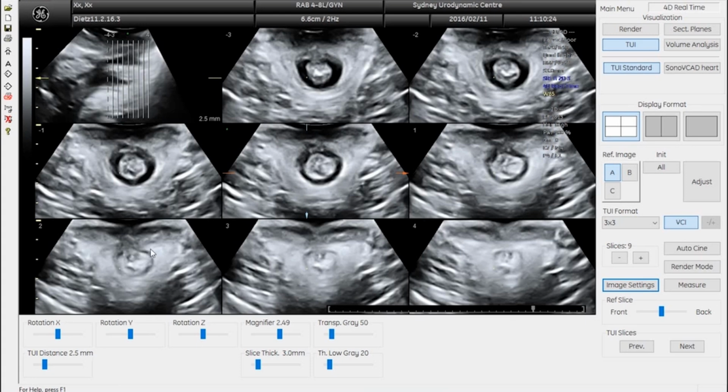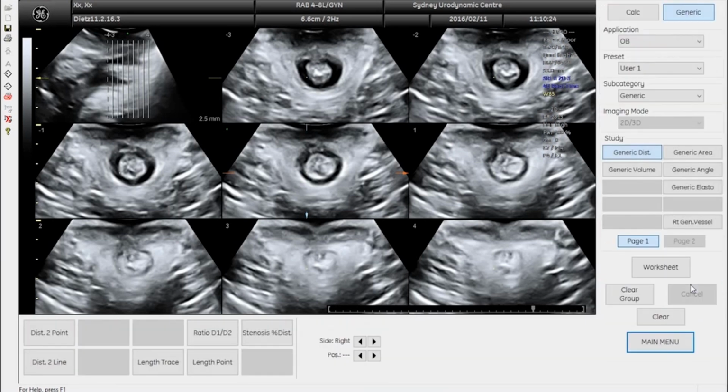However, on the other hand, the external sphincter doesn't really look normal anywhere in any of those slices. Also, there's suture material, some bright spots here and there, here as well, for example, or there, or even higher up. There is suture material there, but I think you appreciate that I will still rate this as a residual defect. Not for the internal, except down here, but for the external.